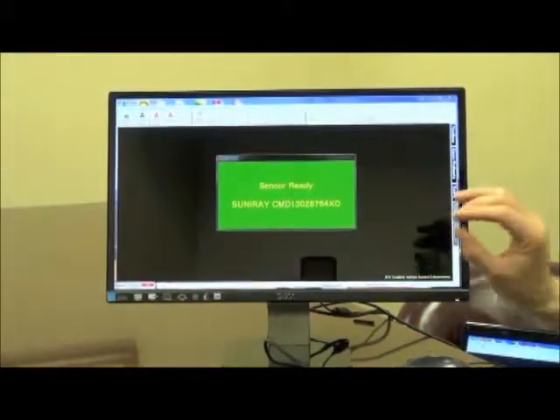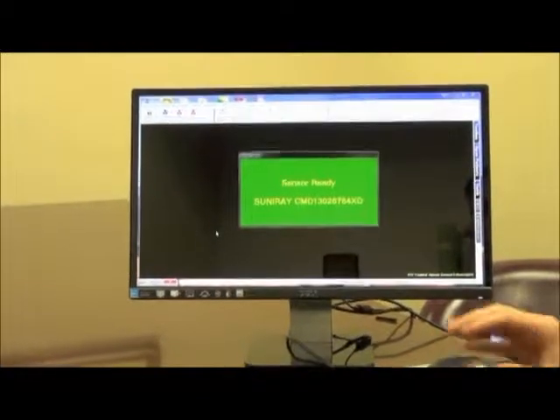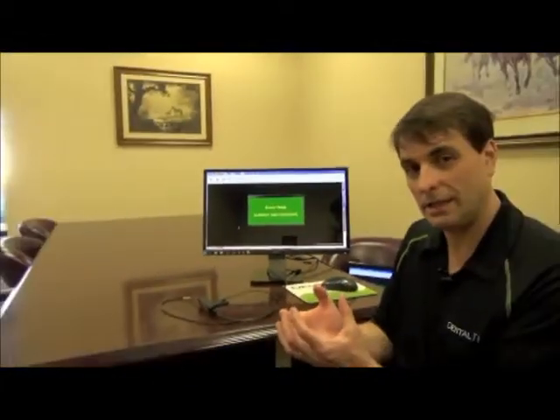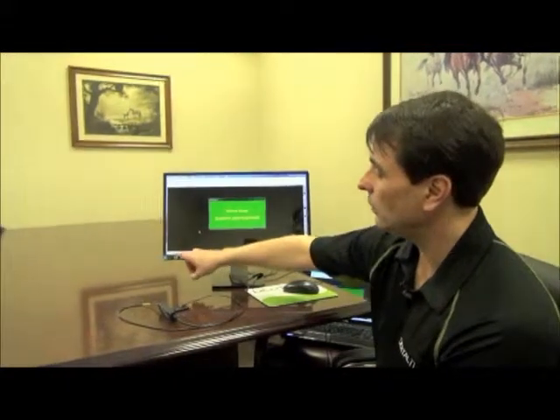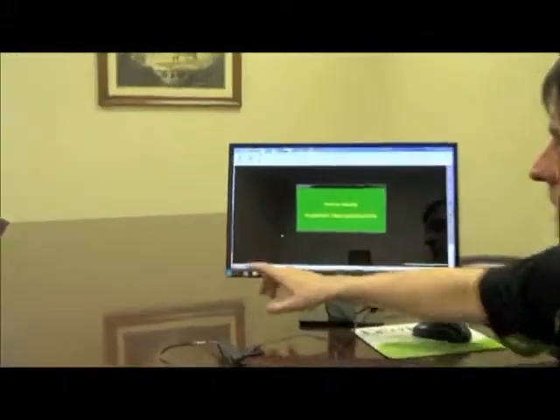I'm going to stop this sensor capture, which if you ever need to do that, so let's say you decided you didn't need to take that X-ray, if you're in individual X-ray mode, down in the lower left-hand corner you'll see a little window that says Capture.